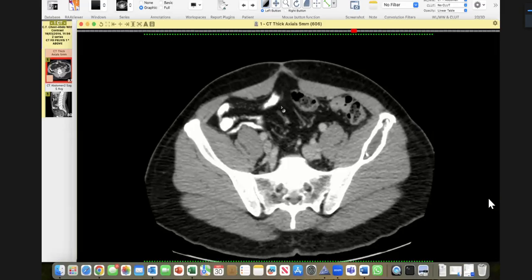So I could have asked you a leading question. Can it be malignant? This will be my question. And you have to stay firm. So say that the lesion is very well defined. It has got thick marginal sclerosis, and these are features of a benign lesion. There is expansion of bone. There is no destruction of bone. This is in keeping with a benign lesion. I'm not worried about malignancy. So stay firm. This is another technique of the examiners: they do check your confidence.